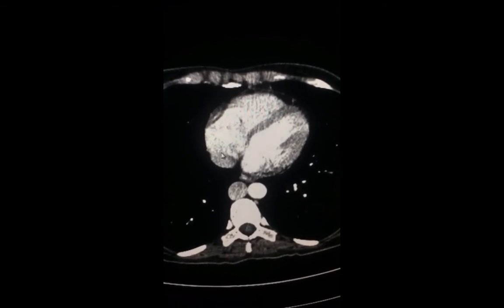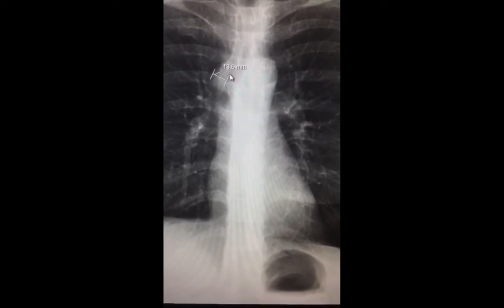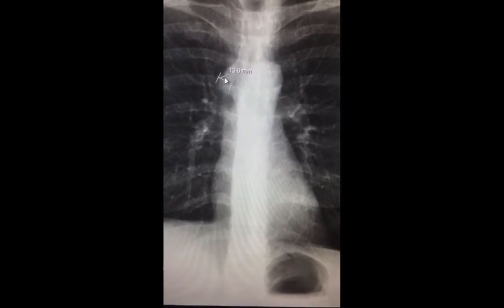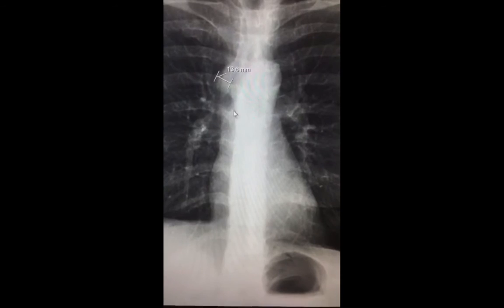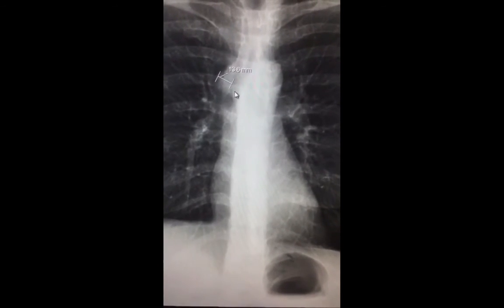So today we learned a neat entity called azygos continuation of an interrupted IVC, but we learned more than that. Now we know our normal azygos anatomy ascending along the spine all the way and above to drain into the SVC. We know that the azygos arch curves on top of the right main stem bronchus, and it should not exceed a size of 1 centimeter.